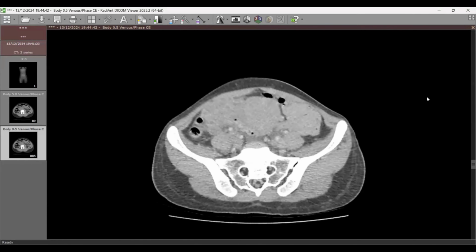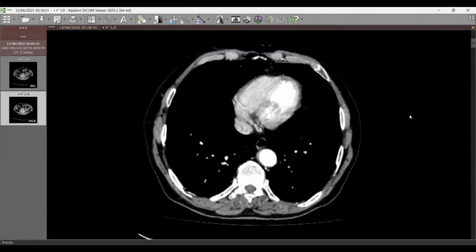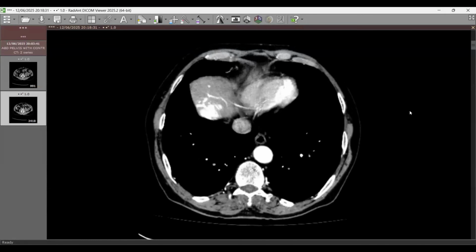I would also like to correlate with any previous imaging if available, or any postpartum history or the gynecological history of the patient. And yes, sir. Okay. Granted. I have been presented with, yes, sir. Yes, now I can scroll.